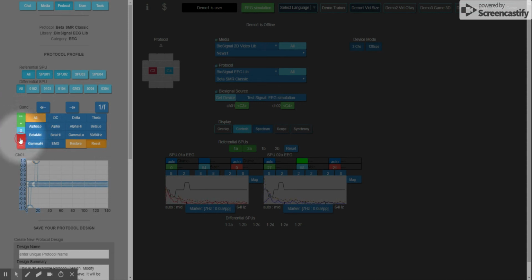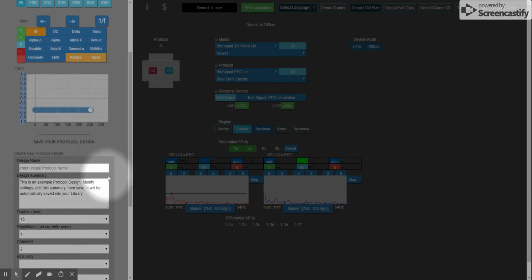We go to half strength inhibit and click all. And I'm not sure what happened there. Half strength inhibit, all. No, not sure. Okay, so what else is here? That might be a bug.